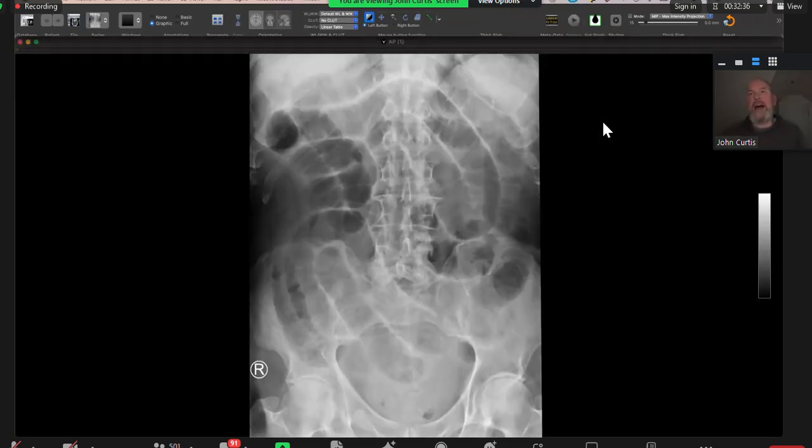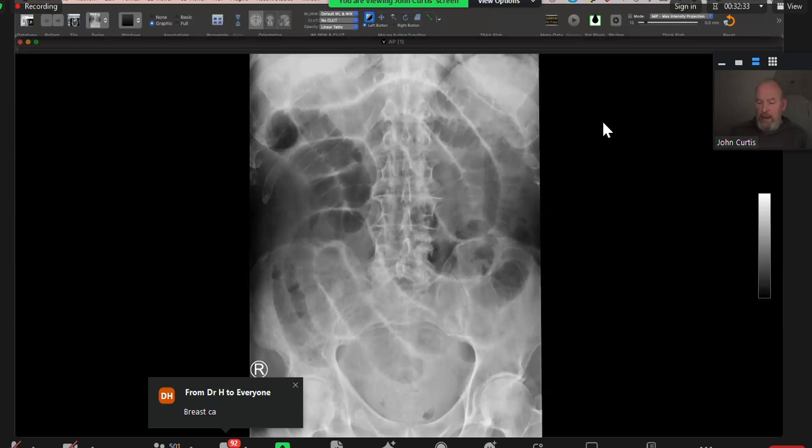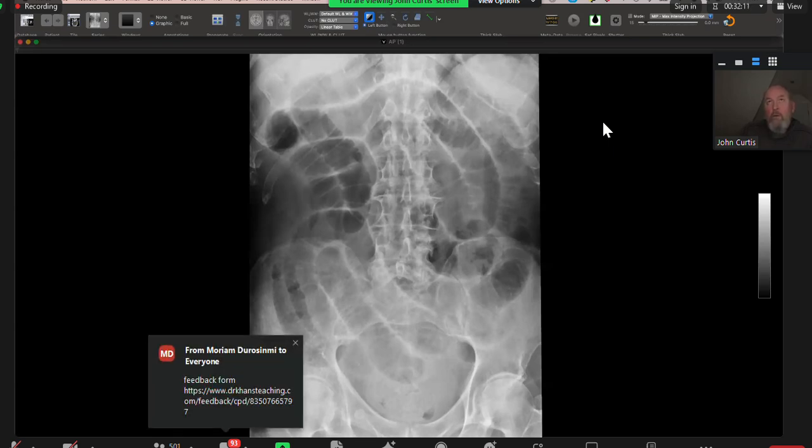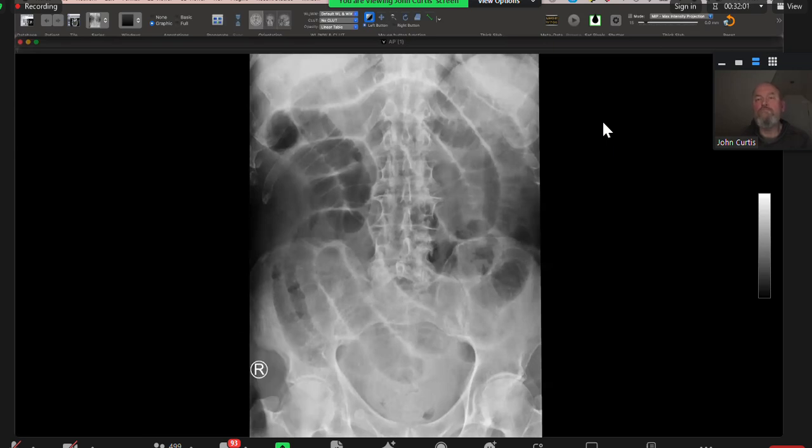Okay, this is an elderly man who has got abdo pain. I have been presented with a frontal abdominal radiograph for an adult patient with a history of abdominal pain. I can see that there is dilatation of the small bowel, including the proximal jejunum and distal ileum. I cannot see any pneumatosis intestinalis. What would you do next? In this case, I will check the hernial orifices for this patient to see if there is any evidence of hernia.